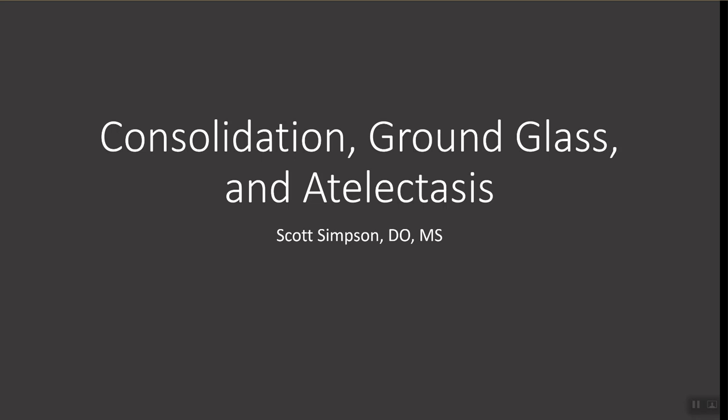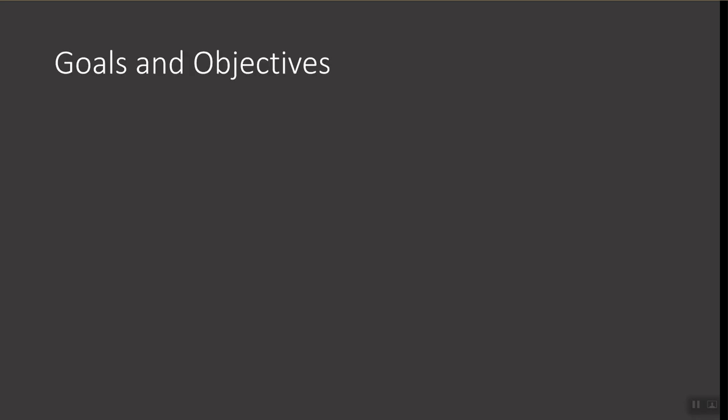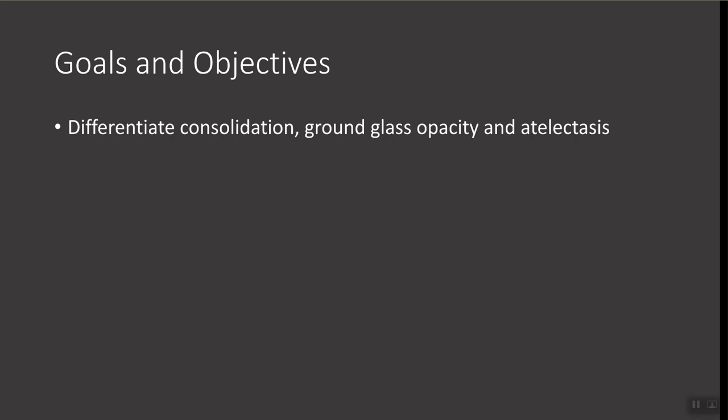Today's lecture topic is going to be on consolidation, ground glass, and atelectasis. The goals and objectives of this lecture are first to be able to reliably differentiate between consolidation, ground glass opacity, and atelectasis. So how can we do that on CT and on chest X-ray?